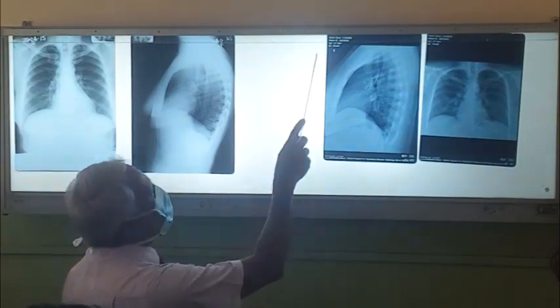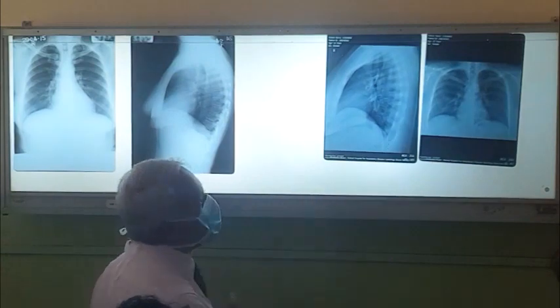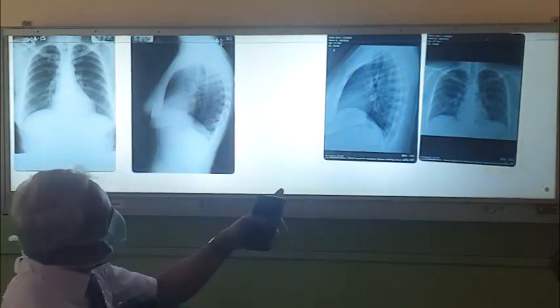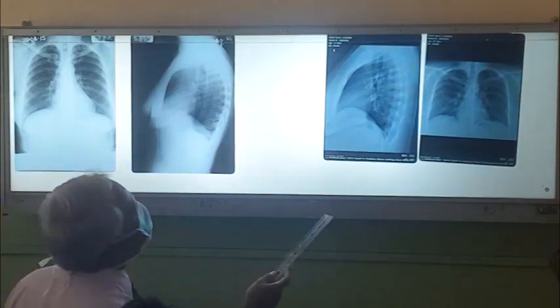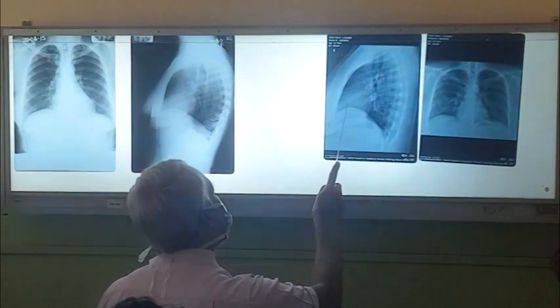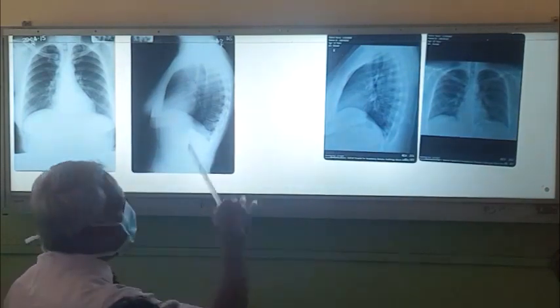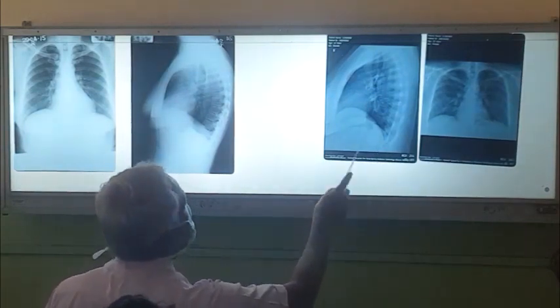So in a right lateral, let's say this is the right and the outer one is the left. Then you can identify the hemidiaphragms, right? Starting from the right, it is the right hemidiaphragm going up to the right side, with nothing above it, so you can trace from this end to this end.